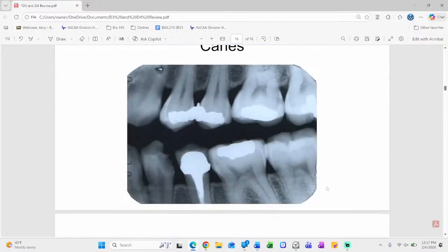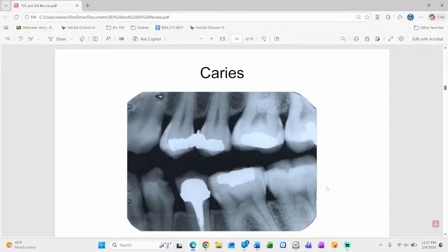Okay, I think we've all seen this picture. Again, looking at bone levels into the dentin, right? So running up and down the DEJ there, running up and down the DEJ here, mesial of 19, of course, huge here on 21.